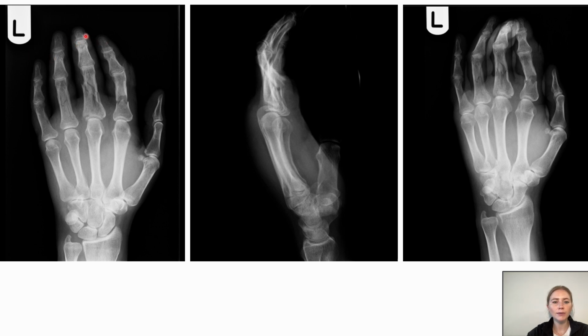So we can see, maybe this isn't the best quality x-ray, but I don't see on any of the views any distal phalanx fractures. The middle phalanges then we move on to, and now we look at the middle phalanx of D3 and you see that there's a little crack through it. That does look like a longitudinal fracture, but it doesn't appear to be displaced. We continue moving on through the proximal phalanges, and we can definitely see some more fractures right off the bat.